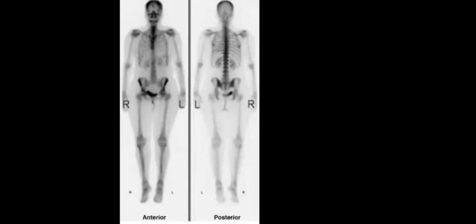So there is normal uptake in the bone scan, probably no abnormality in this case. Then if we go to the CT, do you find any abnormality in this selected image? Right or left lesion? Is it right, left, or both? Maybe on the right side, maybe you suspect that there is a sclerotic lesion.